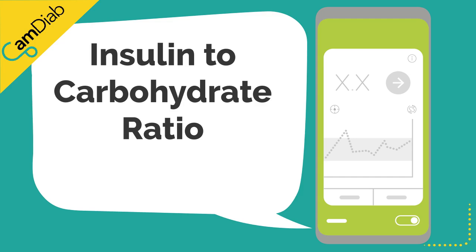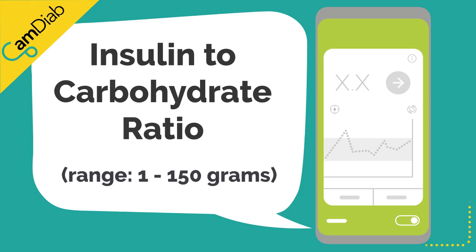4. The insulin to carbohydrate ratio. This is the amount of insulin to be given for carbohydrates entered into the bolus calculator. You can program as many different insulin to carbohydrate ratios across the 24 hours of the day as required.